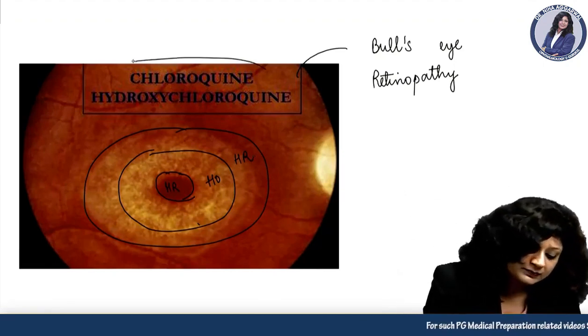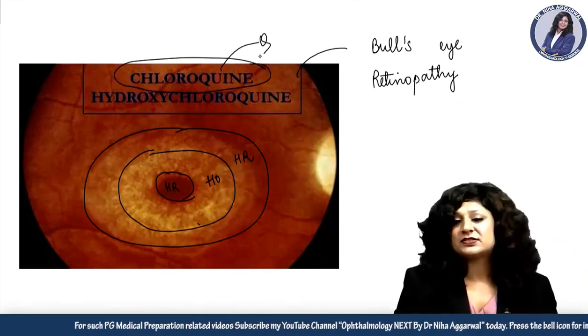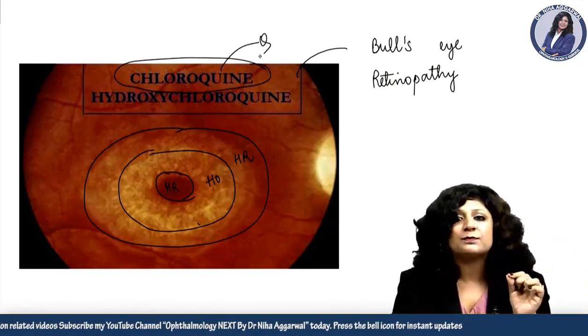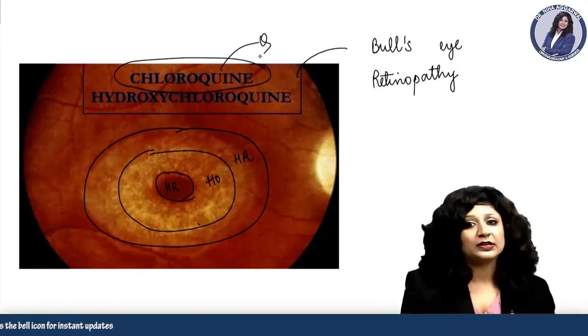And a very important MCQ, which drug is causing it? That is chloroquine. It is chloroquine which is responsible for causing this typical bullseye retinopathy, that is hydroxychloroquine or chloroquine.